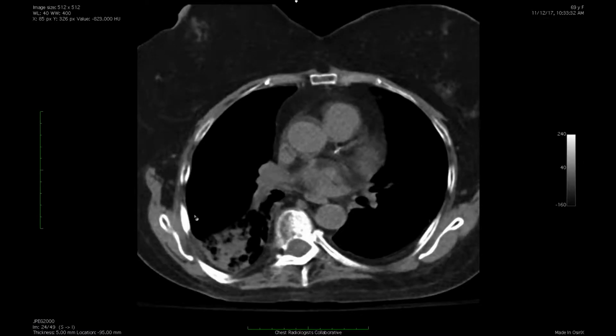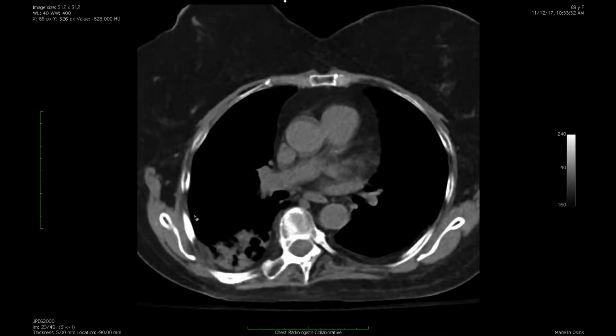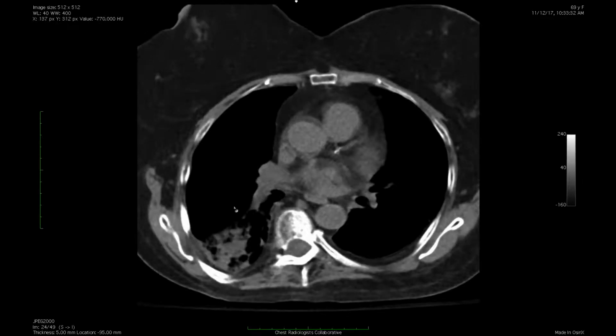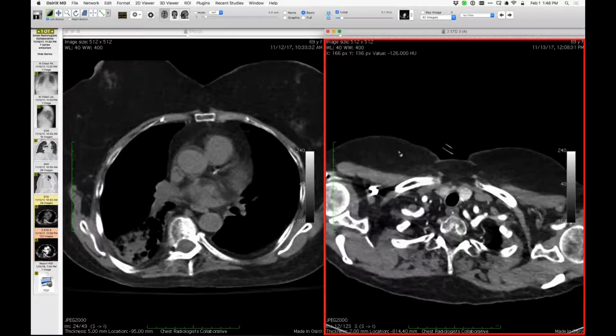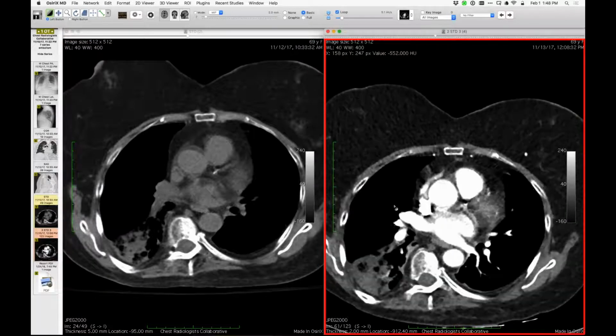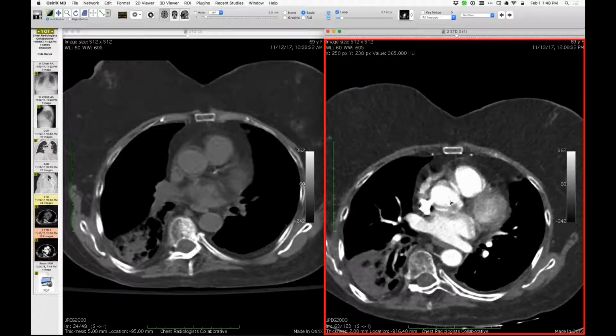Huh. It looks a little low, if anything. Maybe that's just... I wondered, because I looked at that and I said, well, I wonder if that's a little bit dilated, and I wonder if there is something that's a little bit low there. So you're kind of warm, but as you'll see, it turns out that not all of this actually is what you now know is going to be there, which is embolus. So we'll go to that and scroll down here.